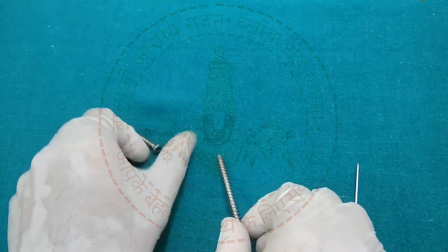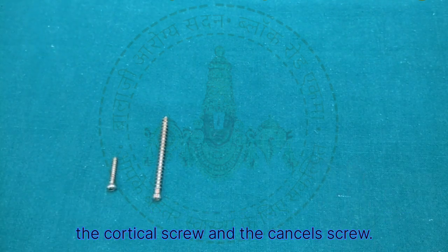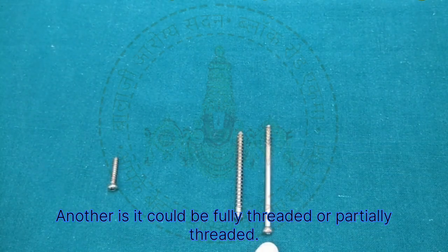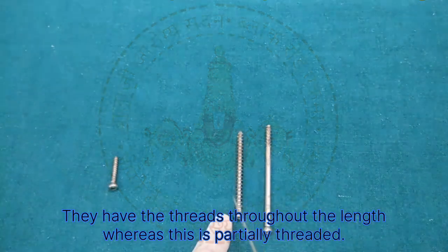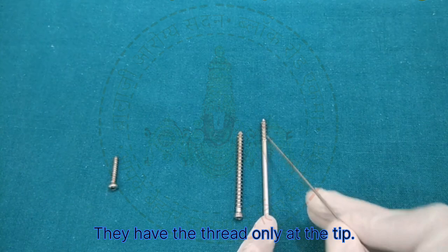So one is the cortical and the cancellous. This we have covered, that is how to differentiate between the cortical screw and the cancellous screw. Another is whether it is fully threaded or partially threaded. You can see here that these screws are fully threaded, that they have the threads throughout the length, whereas this is partially threaded, having the thread only at the tip.